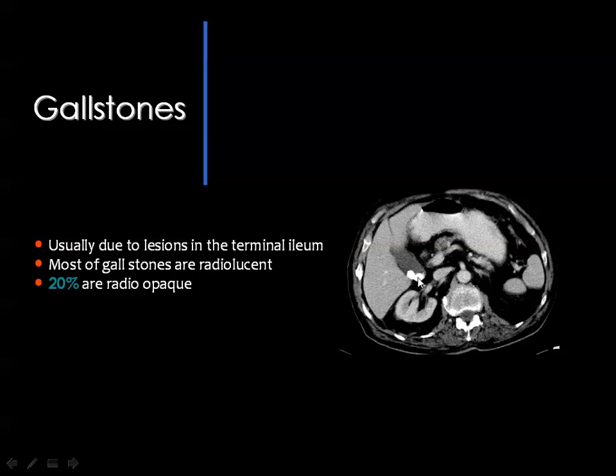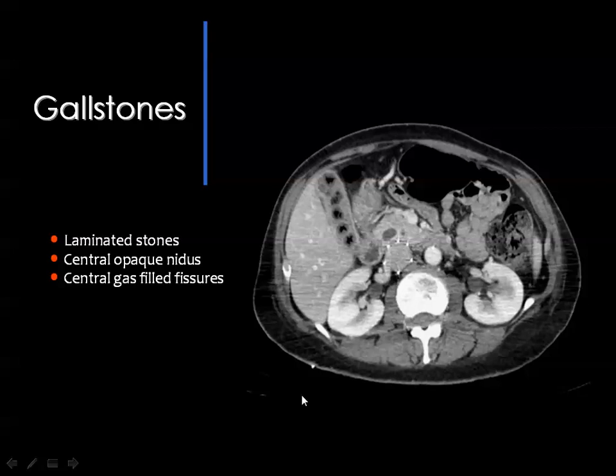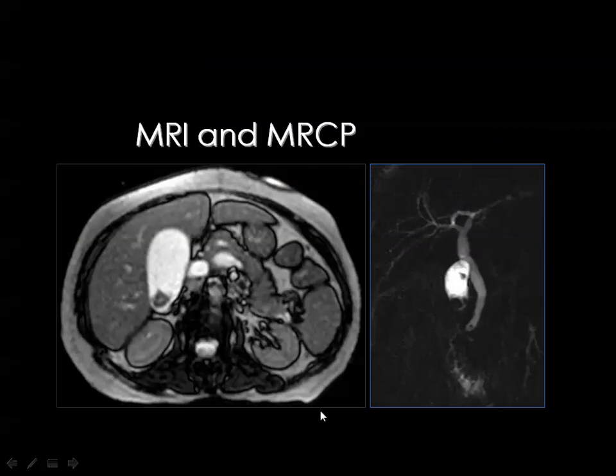This is the gallbladder, and these are two radiopaque stones, and this is a frequent incidental finding during CT examinations performed for any other indications. And gallbladder stones also may contain gas sometimes, and you see this is the multiple gallbladder calculi by CT scan, and you see extreme hypodensity within the stones representing gas. This is the appearance of gallstones by MRI. This is the gallbladder, which is distended by hyperintense fluid, and this is the low signal stone inside.